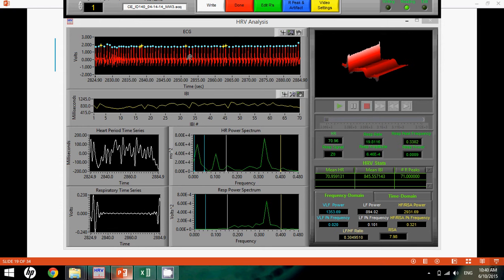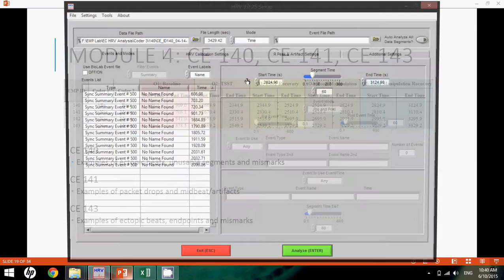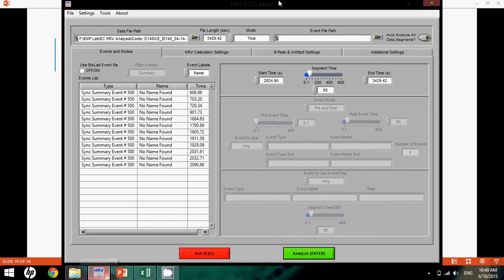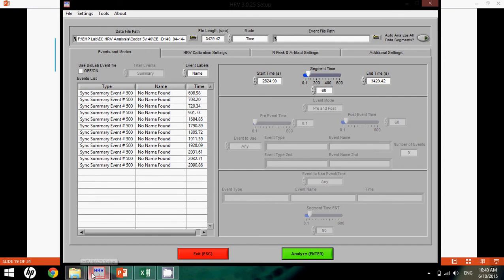We can see after all five are completed that we really don't have any adjustments to make. You can either automatically or manually write all these data points, and they'll go to your Excel sheet and automatically save.